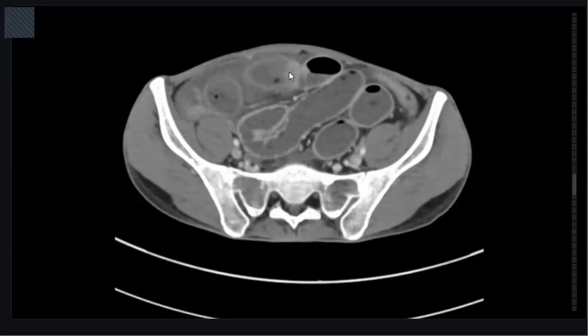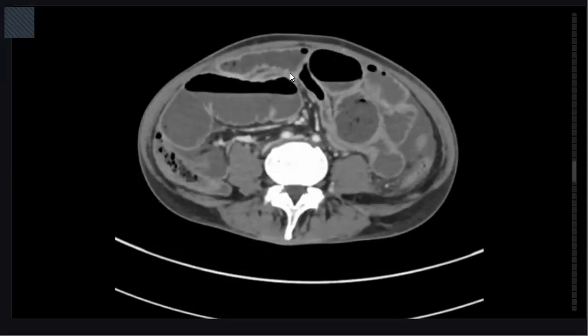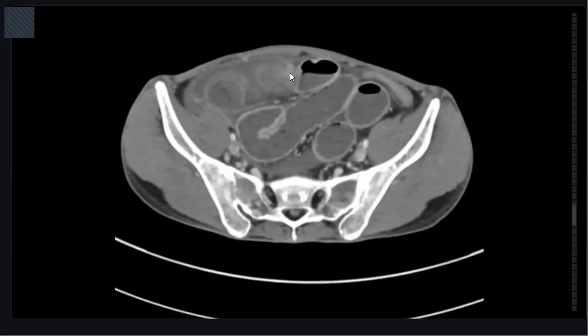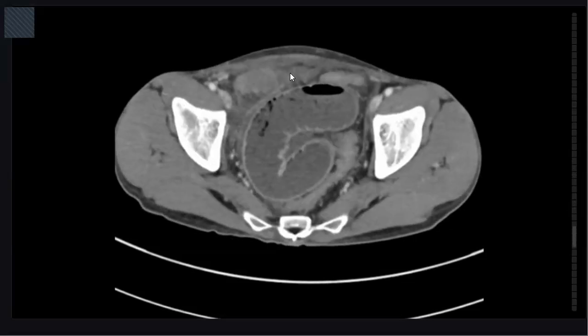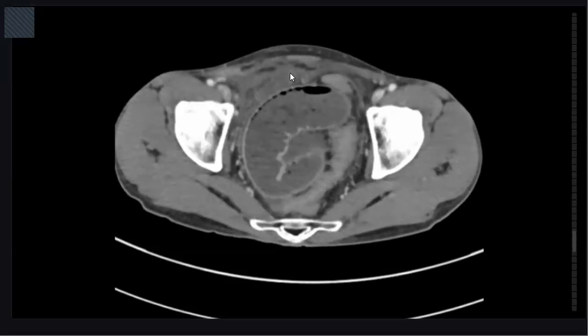The possible causes in this patient are adhesions, and also it could be a metastatic lesion. Any complication of this left nephrectomy? No, there is ascites, a mild to moderate amount of fluid collection in the abdomen. No evidence of pneumatosis or portal venous gas at this region.